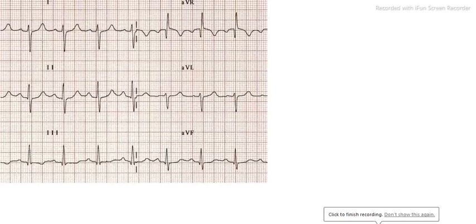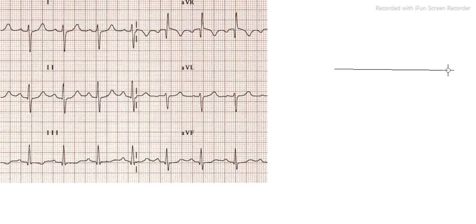Greetings to all. In this video again we will be trying to find the axis looking at the ECG. As I have already discussed in previous videos, to find the axis what I generally prefer is to first draw a lead 1. So this will be your lead 1, and next which I prefer is drawing AVF.